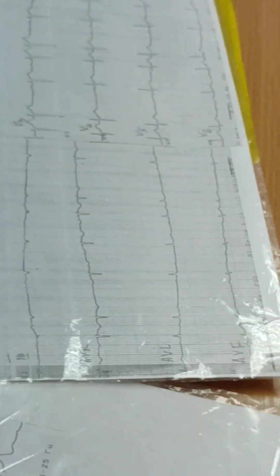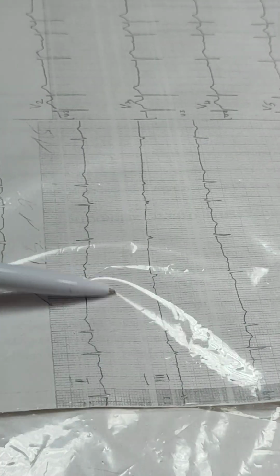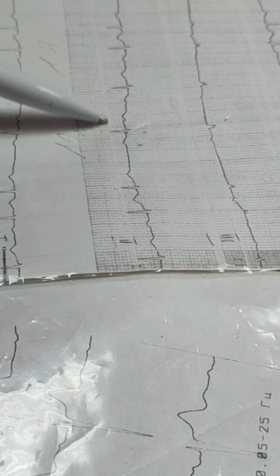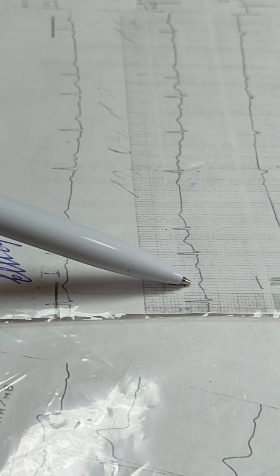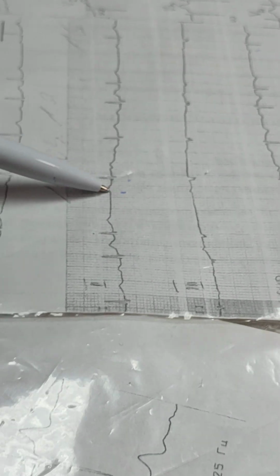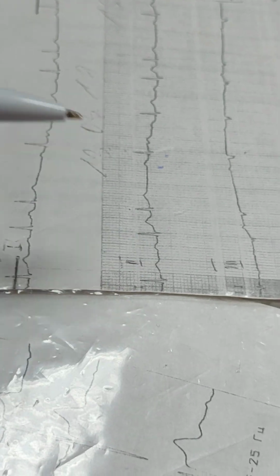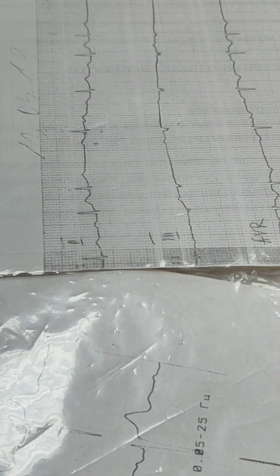This one. There is arrhythmia. So the arrhythmic place is here. This distance is short, shorter than the previous one or the next one. This distance is long, longer than the next one. P waves: present, absent, present, present, present, absent, and pause again. So no P wave, and there is a short coupling interval, long compensatory pause, supraventricular extrasystole.